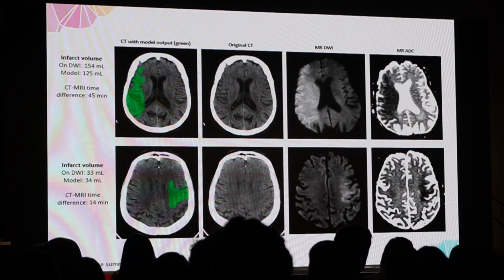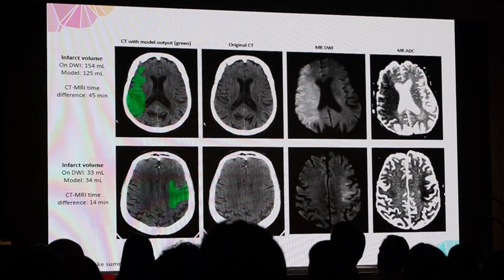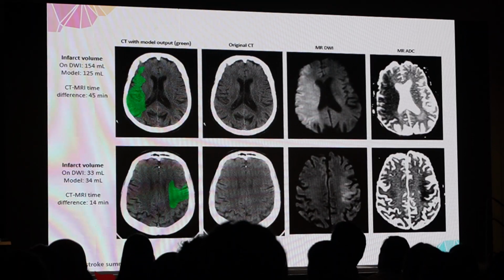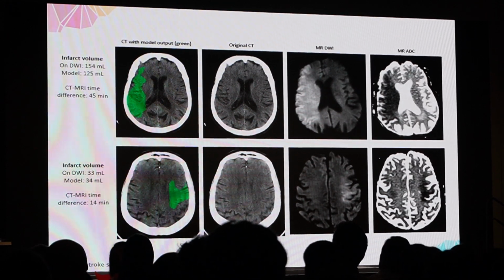Okay, but we had this unique data set where we had immediate diffusion following, so later than the CT scan. So if anything, we were biased towards not seeing the stroke on the CT scan because the diffusion was after that.